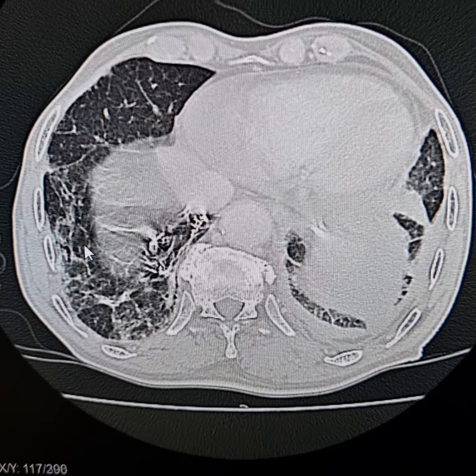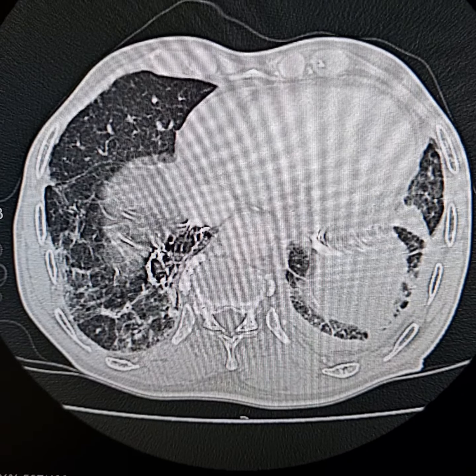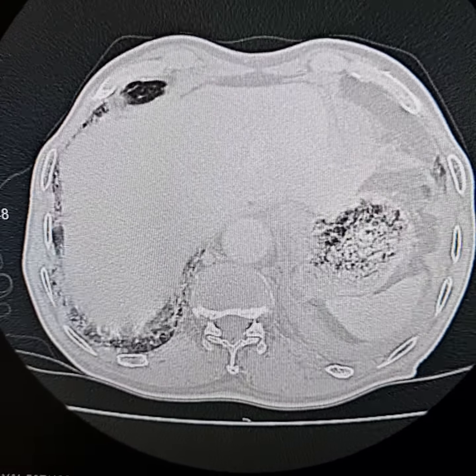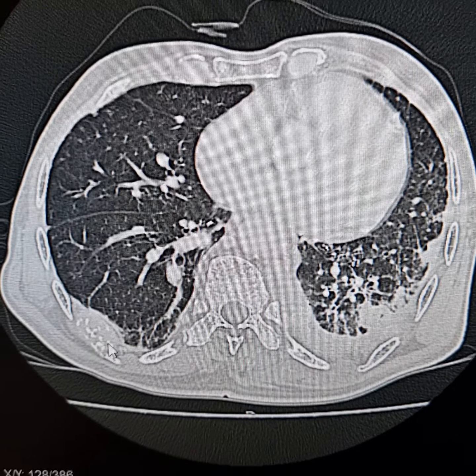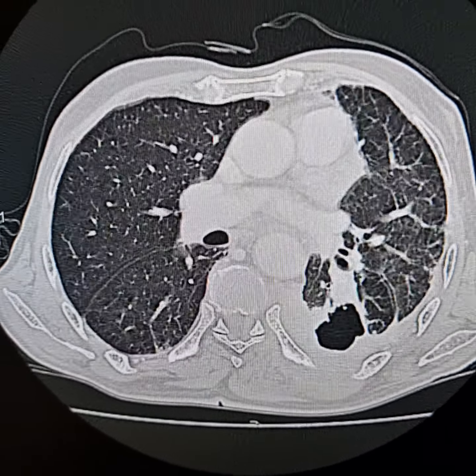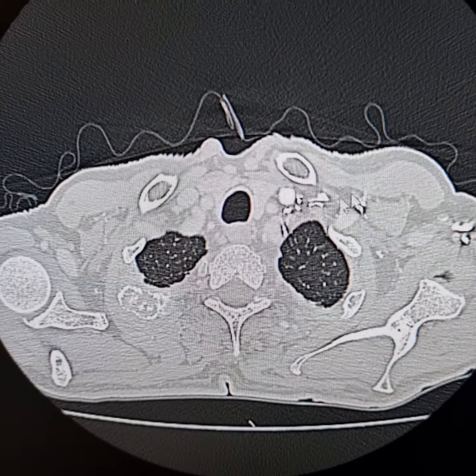Now these interlobular and intralobular septal thickenings may be because of smoking-related interstitial lung disease. There is metastatic erosive destruction of the right 8th rib and right 2nd rib. This one here.